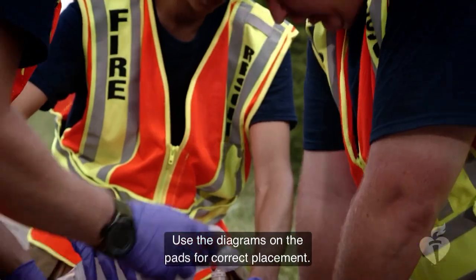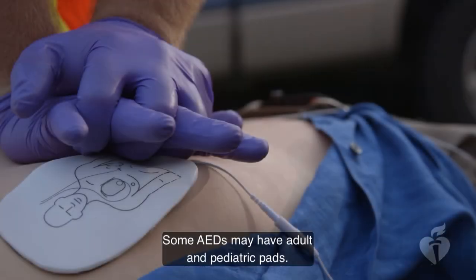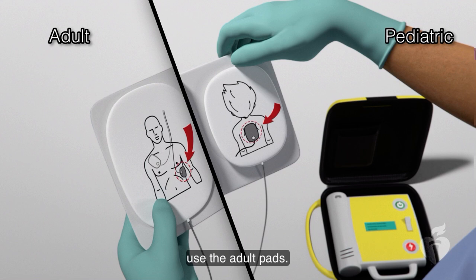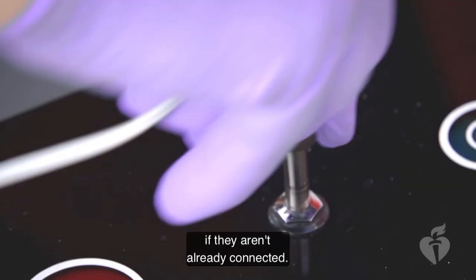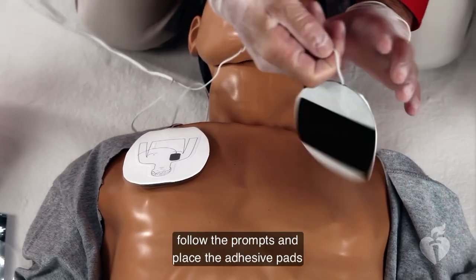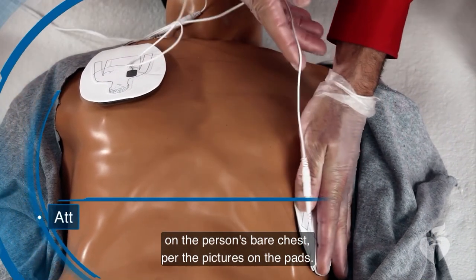Use the diagrams on the pads for correct placement. Some AEDs may have adult and pediatric pads. Be sure to use the adult pads on anyone 8 years of age or older. If you're not sure of the person's age, use the adult pads. On some AEDs, you may need to plug in the pads if they aren't already connected. After you open the device and power on the unit, follow the prompts and place the adhesive pads on the person's bare chest, per the pictures on the pads.